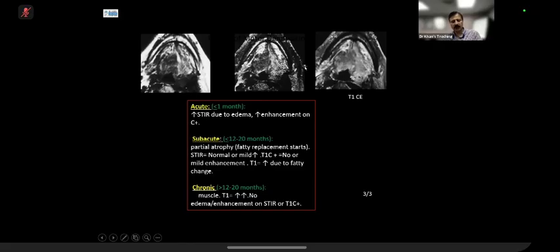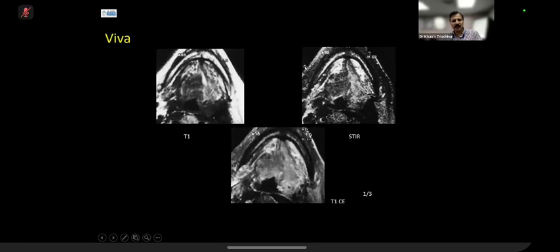I have shown you this case before, and it has come in the exam, by the way, this tongue denervation. And it can be shown to you on a CT scan with fatty infiltration. And the same concept occurs in other muscles also.